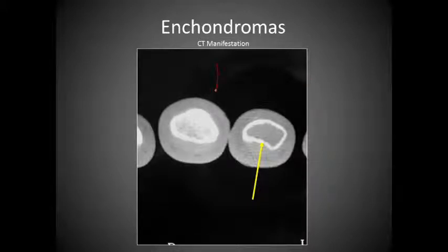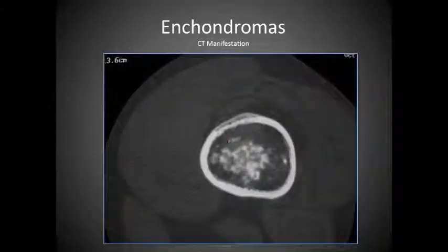This is a CT of the fingers, and as you can see, this is typically what the fingers should look like. This is what the fingers should not look like, and you can see that there's excellent density inside of this finger. However, there's hardly any density outside of the periosteum for this finger, and so it would be surmisable that very little trauma would induce a fracture for this finger.